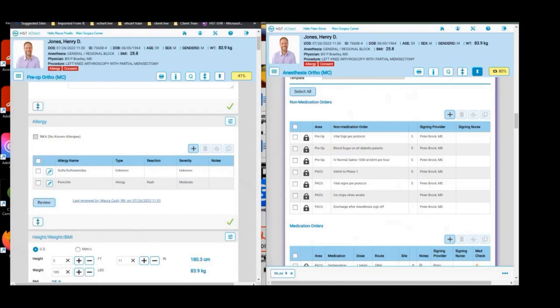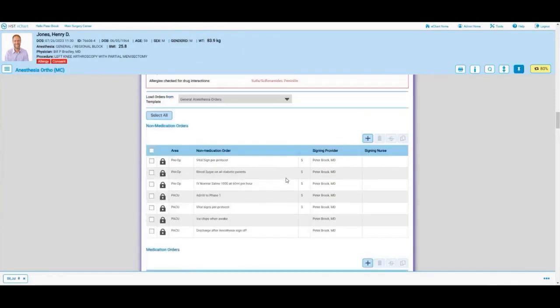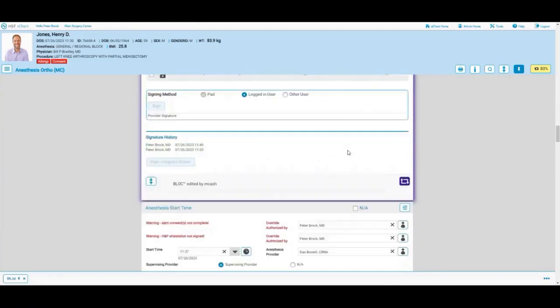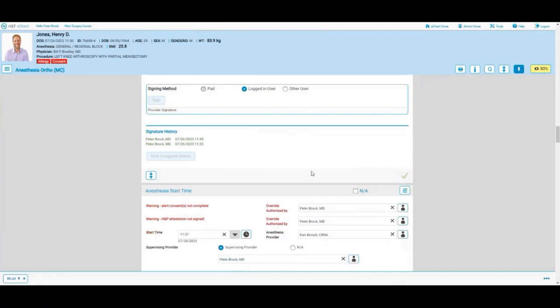On the right, you will immediately see a purple halo. The purple halo is an indication that another user has made a change that will affect my care of this patient. It will tell you who made the edit, and you get a little indicator that you must acknowledge.